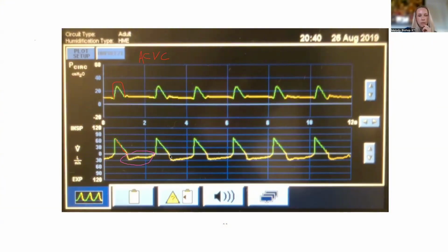All right. So would you agree that the expiratory flow curve is abnormal? Absolutely. Normally, we should have this peak expiratory flow based on the characteristics of the lung, then this natural decay return to baseline, right? I'm going to try to draw this, so bear with me. Pretty good, right? So then it should be this sort of purple. And we don't have that, not even by a long shot.